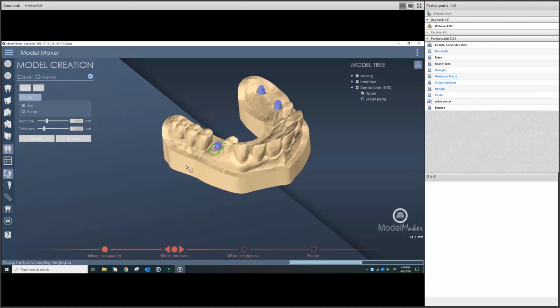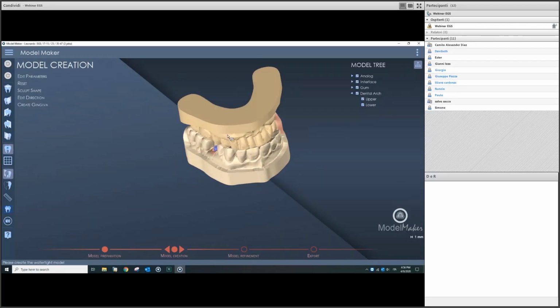Click on apply. Okay, so we can move on.